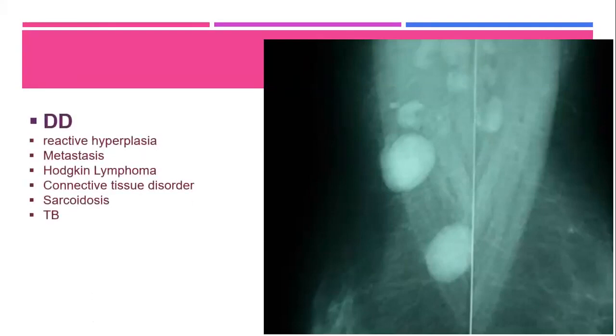Pathological lymph node, but not malignant lymph node. So mammography is not very helpful in differentiating benign from malignant. At least sometimes we can say pathological lymph node based on mammography, and even a pathological lymph node sometimes could not be detected on mammography.